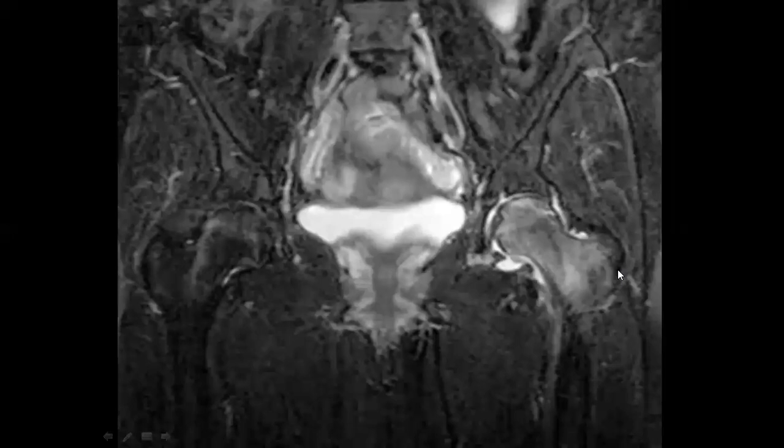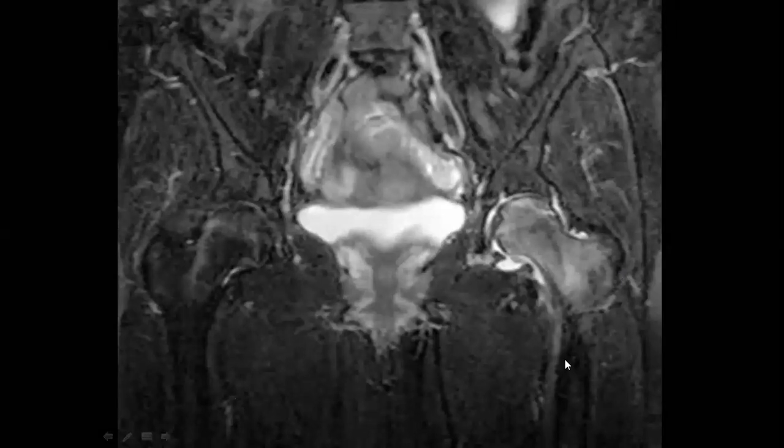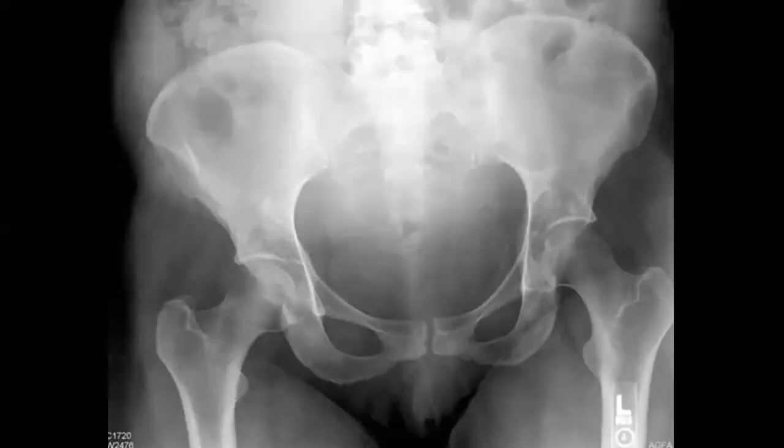In the MRI, you have this typical appearance, and no DDH at this age. You need to go to a younger age to mention it in the exam. DDH no, septic no, because you need to have a wide joint space. We mentioned it before. Transient osteoporosis, perfect. Amna, nice. Sally, nice. Shemia, nice. So you have transient osteoporosis.